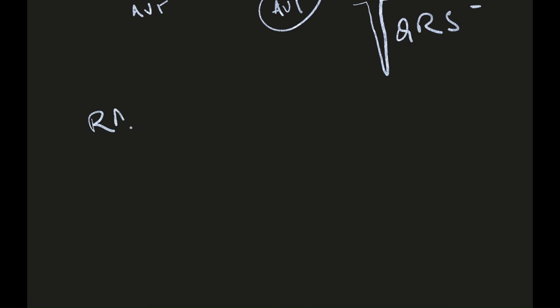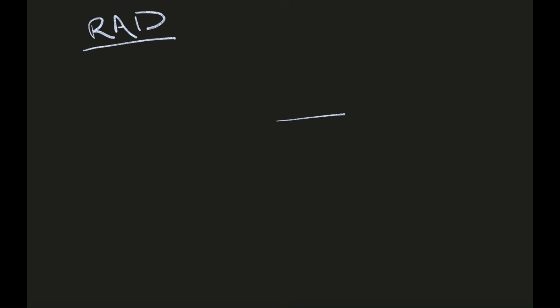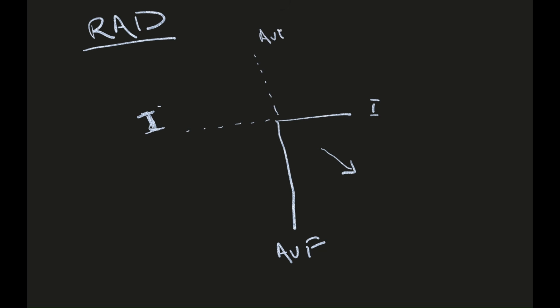Now, what about right axis deviation? Just apply the same logic, the same basics that I have told you. This is lead 1, this is AVF, this is normal axis. Now this one is negative lead 1 and this one is negative AVF. This is the region of right axis deviation. Your right axis deviation axis lies over this region.